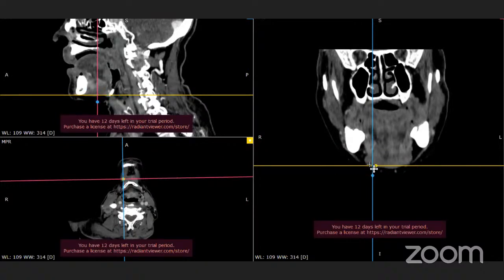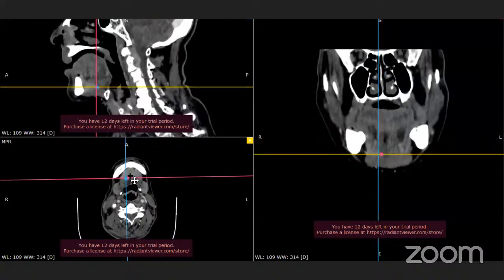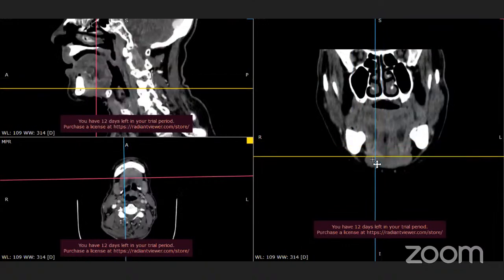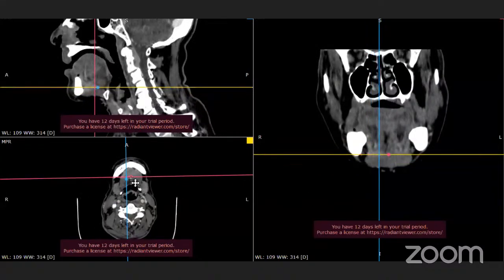This one is the anterior belly of digastric. As we go higher up, this is the mylohyoid. At the midline, these are opposed to each other, so it will be difficult on axial, but the bigger, larger muscle is the anterior belly of the digastric. As you move a bit higher, this is the mylohyoid on the medial margin of this.